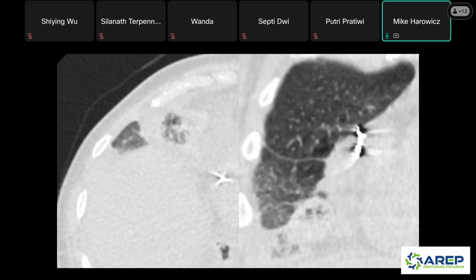Is this a good look for pulmonary edema? I would say no, right? Again, this is the only real opacity besides a little bit of interstitial edema that the patient had everywhere. Is this trauma related? No, the patient doesn't have any recent falls. It didn't come in with trauma. Could this be aspiration? I would again say no because it's mostly in the right middle lobe, very anterior. So while it could be, it's sort of an uncommon location for that.